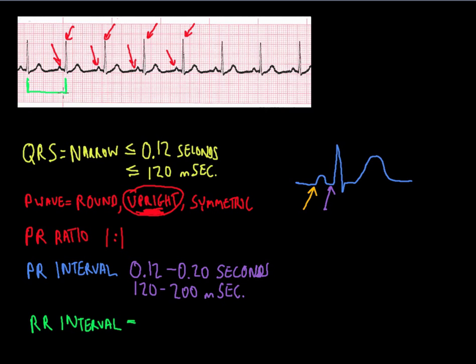If you look at this gap here, you look at this range, I'll tell you what, let's do a really dark version of green here. Let me try this, see if this works a little better. That gives you the idea. Okay, it's almost black, but anyway. So this distance is between the beats. I'm measuring the big, tall, spiky, pointy things here. And as I measure this out, I'm finding that these are all about the same.